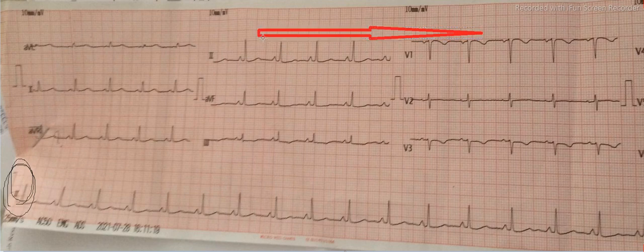I will draw AVF. I personally prefer drawing lead 1 and AVF. If you go and revise the basic fundamentals of ECG in my previous videos, then you will understand why lead 1 is in this direction and AVF in this direction. Generally the leads are directed towards the left and downward respectively in lead 1 and lead AVF.